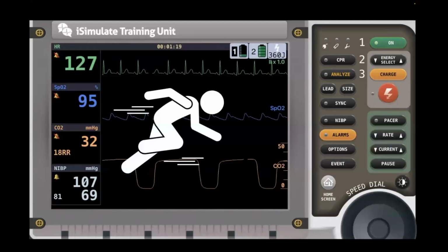So for the first rhythm here, we have our monitor going across, and you should let somebody know about it. We have our P wave, a little squiggle, then our narrow QRS, so it's definitely coming from the top of the heart. Because it has a P wave with every QRS, this is a sinus something. In this instance, it's a tachycardia, so this would be sinus tachycardia. The rhythm impulse is triggered by the sinus node or SA node.